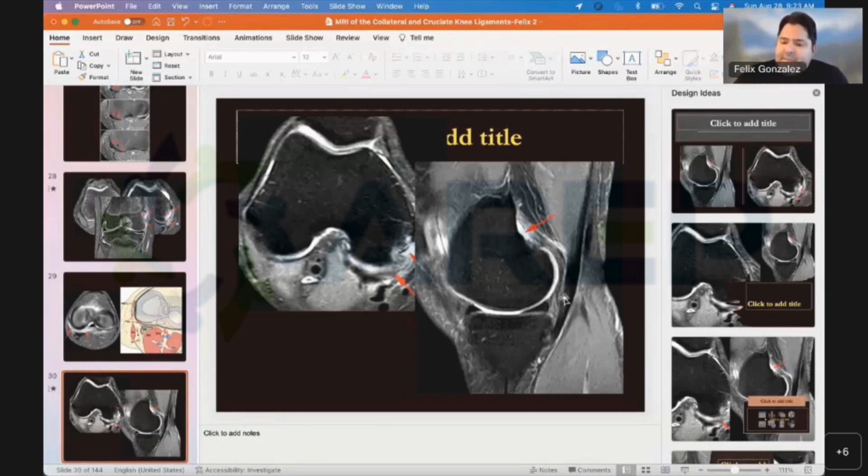For me, if I see edema limited to these ligaments, just in this compartment here, without affecting the anatomy of the meniscus, I call it meniscal capsular separation injury. But if I see even the slightest sign that the red zone of the meniscus is torn and violated, I would say meniscal capsular injury with peripheral longitudinal vertical tear of the adjacent meniscus, and I will say, correlate clinically. So that's my take on it, basically.